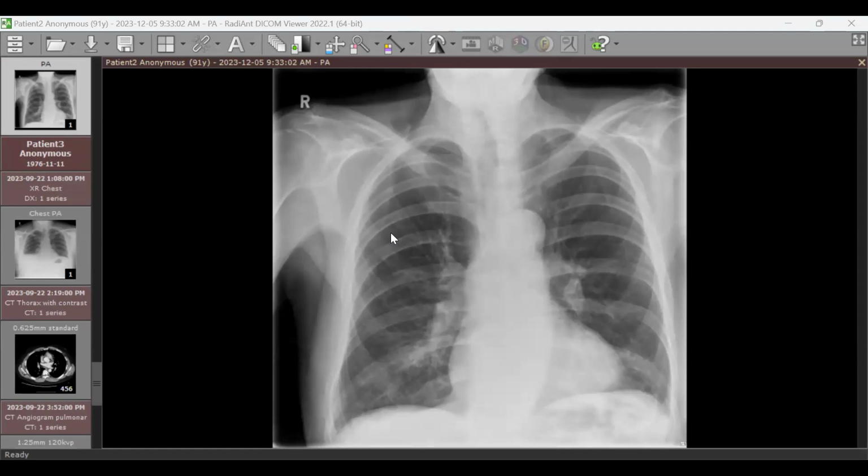This patient presented with the same presentation, sudden shortness of breath, right-sided. Okay, this is a frontal chest X-ray of a 91 year old male. The exposure of the chest X-ray is good. No frank rotation. And I think it is an inspiratory film. Good. Well, there's a little bit of rotation, but no problem. That's not our issue now.